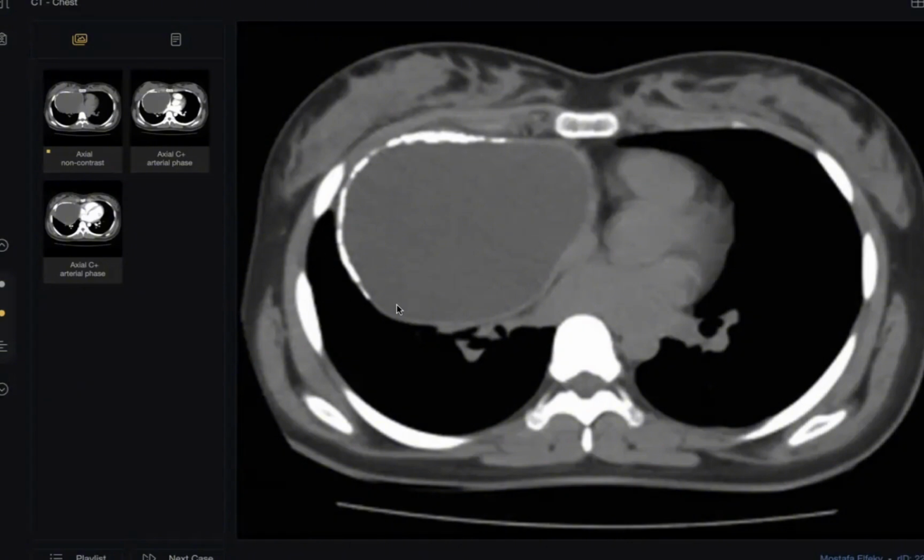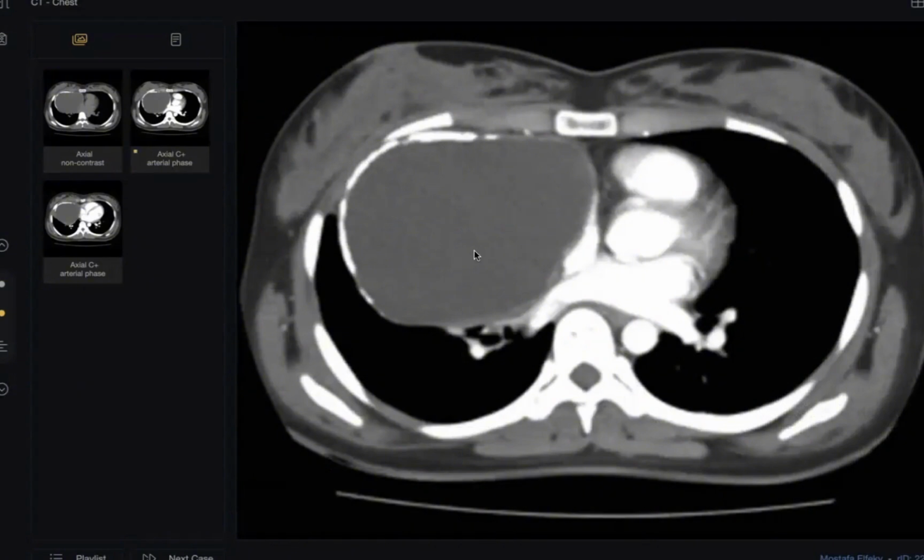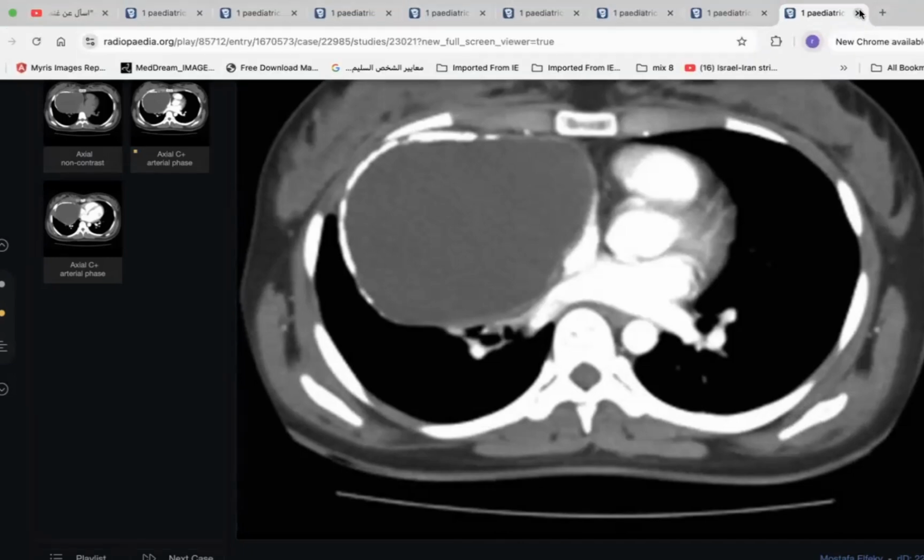Teratoma? No. Hydatid cyst. Excellent. In my opinion, when you see calcification like this and it is large, think of hydatid cyst. By the way, my colleague, it is finally bronchogenic, but it is a case of differential diagnosis, so give as many differentials as possible. Thank you, doctor, so much.